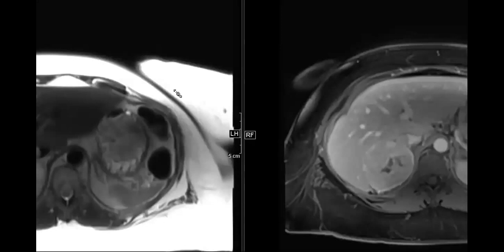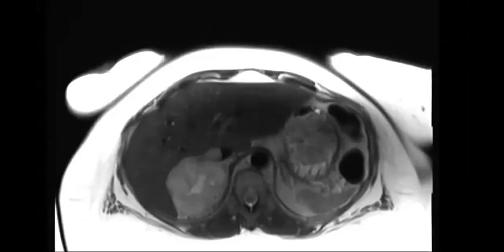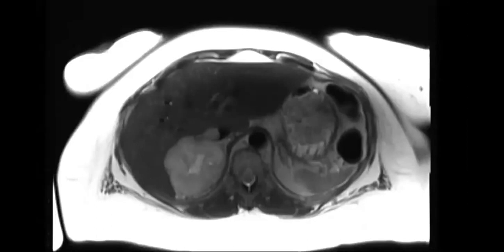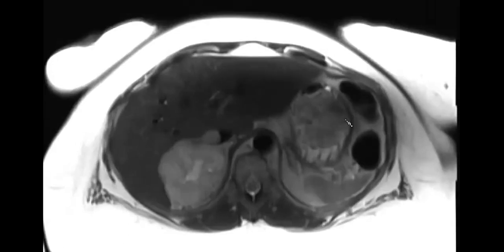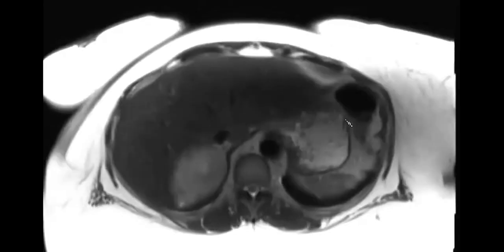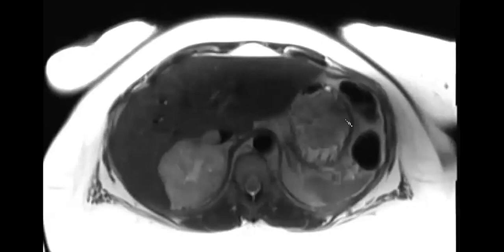But I've also learned that when the signal intensity of a lesion is this bright on T1, it's usually going to be blood or protein, unless we're looking at melanoma mets. Live tissue, unless it's melanoma, is not ever this bright on T1. Just to go back to it, this T1 is exactly what a hematoma looks like. Often it has this rim appearance of different blood products along the edge that are more congealed. So it's really nice.